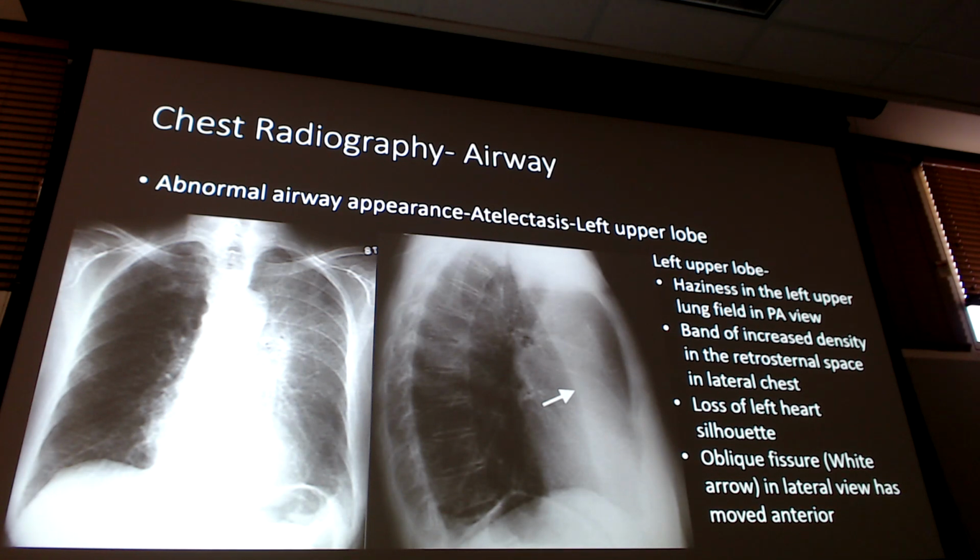and look at what the lower lobe has done. The lower lobe has come up to fill that space. That's why we are so much more darker here on this part of the lateral chest x-ray than we've really ever seen before. And look at how prominent that fissure line is. Right? We haven't really seen a whole lot of the fissure lines on the lateral x-rays.